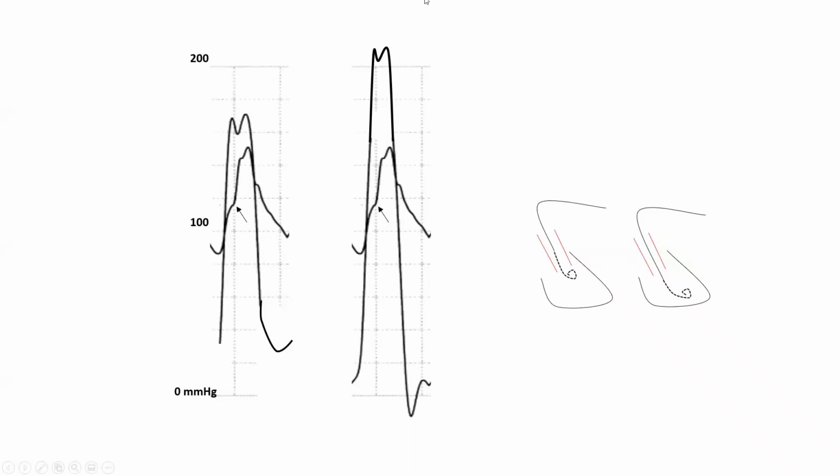For the first image, it seems like the morphology is pretty good. You said everything looks great. It doesn't look damped. When would you suspect an error? If I was a beginner looking at that morphology, I would think that it's a good reading and move on.